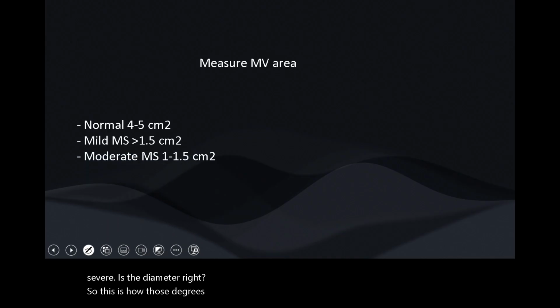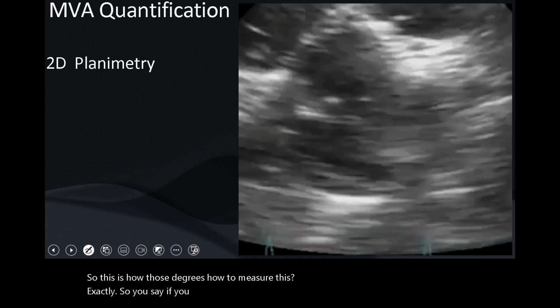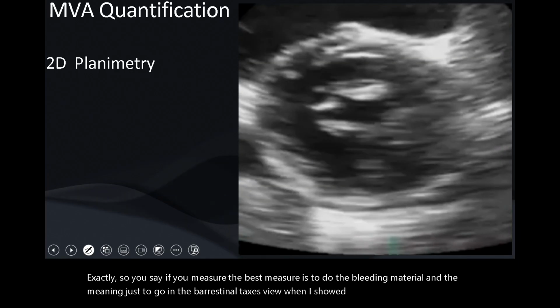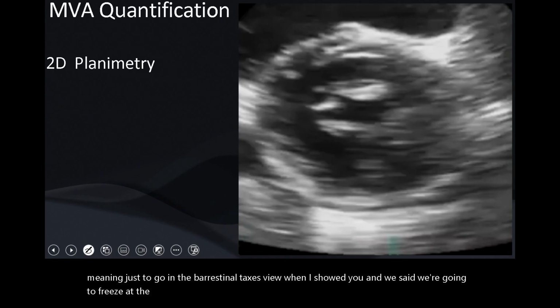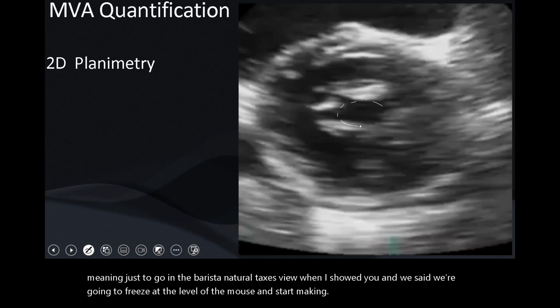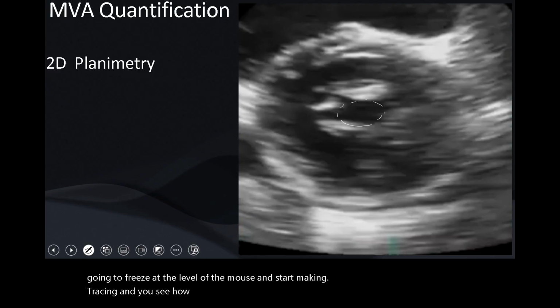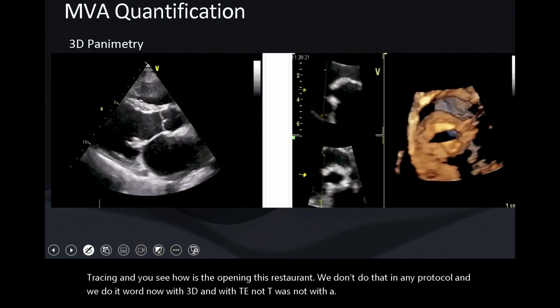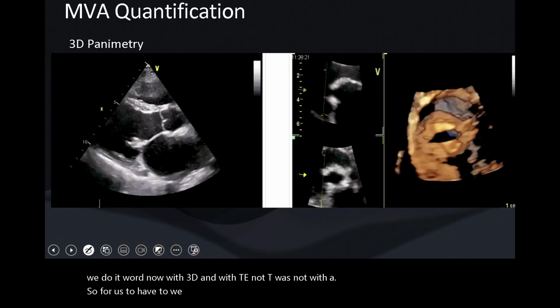How to measure this? The best measure is planimetry, and for planimetry you go in the parasternal short axis view, as I showed you, and we freeze at the level of the mouth and start tracing, and you see how the opening is. This is the best one. We don't do that in any protocol in TTE. We do it more now with 3D and with TEE, not TTE. Not with thoracic, we do it with esophageal. So for us, we do it with 3D planimetry or with transesophageal echo.